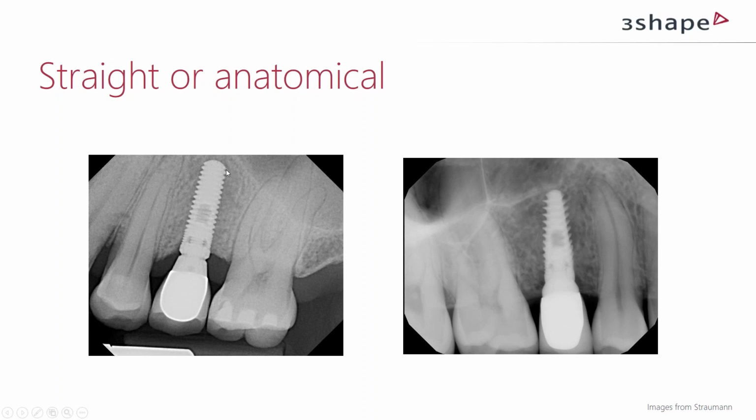On the other hand, with a straight implant, for example, in a newly extracted tooth, we can see how the threads actually grip into the bone in another way. So again, depending on the bone quality, fashion, the surgeon's favorite, both are as good, especially in this position.